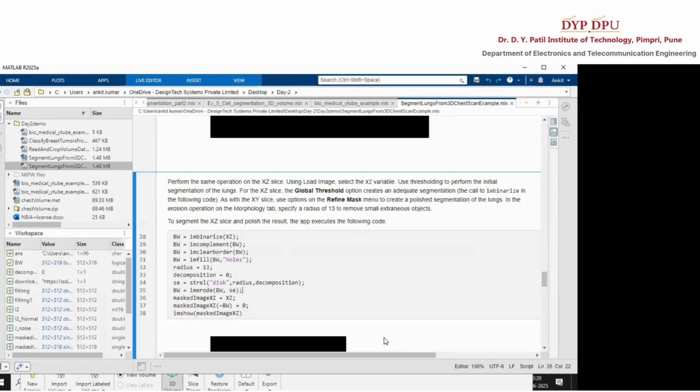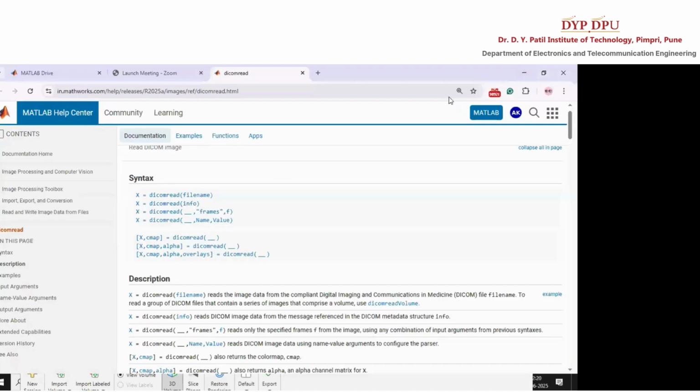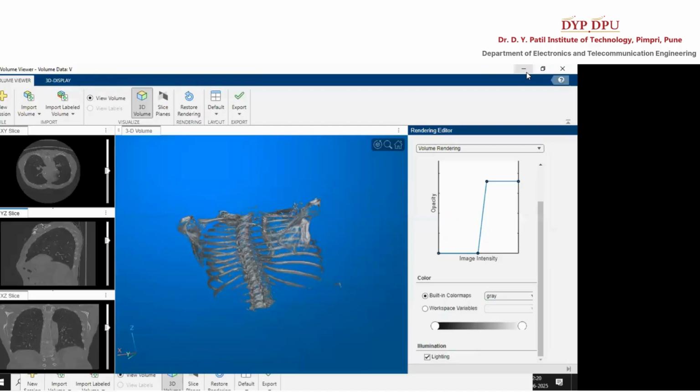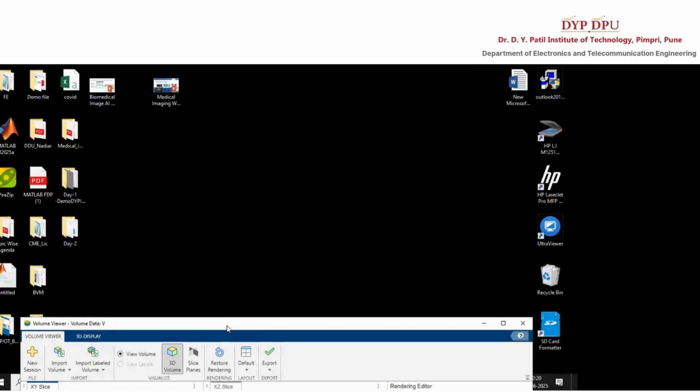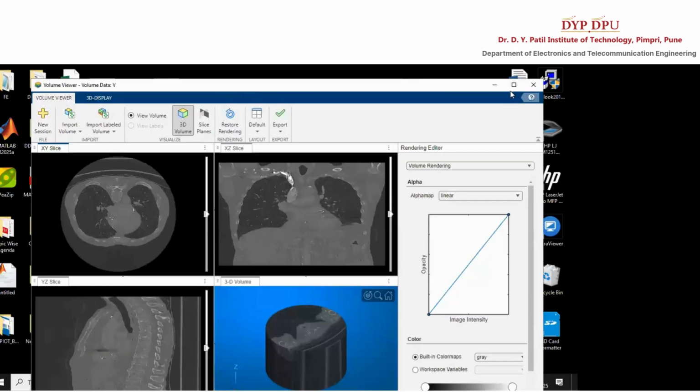Now the volume viewer is over, so I am just closing this.